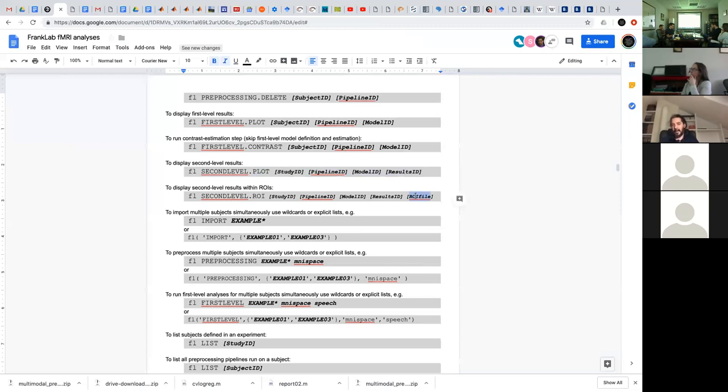What I'm working on is adding the ability for this process that computes the ROI level analysis to handle this type of different files per subject. So it knows that it needs to extract the data differently from different places for different subjects. So in the case of a group ROI file, I would specify the whole path to that file, like to that nifti. Right, exactly. So this is an actual ROI file. This is a whole path.